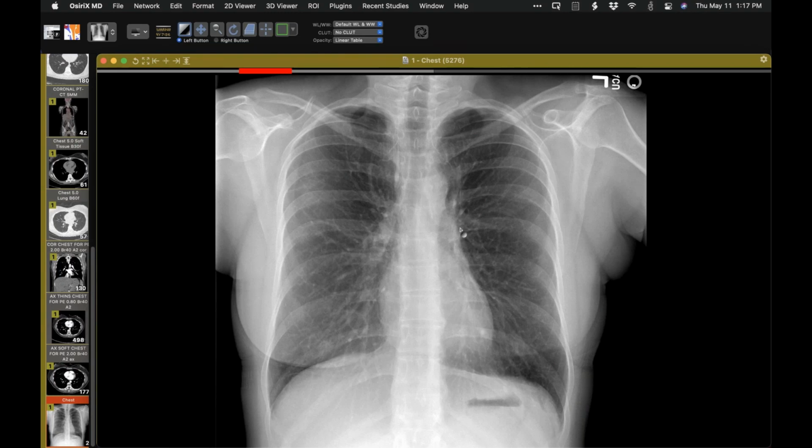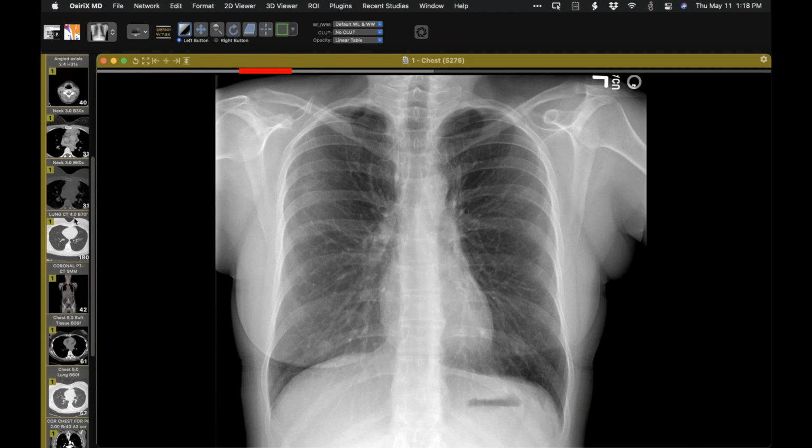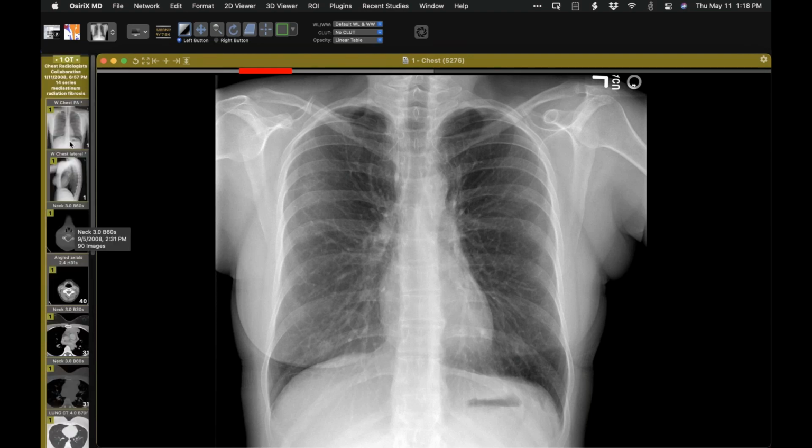Okay. Jeff, keep on the thought of the left hilar region. What is it about it that looks off? Well, I don't see the left pulmonary artery coming out and branching. And it looks like the left lung is a little more lucent in the upper portion. I think that goes along with what Travis is pointing out too. Could there be some volume loss and elevation of that left hilum distorting the pulmonary artery? Okay. Excellent.